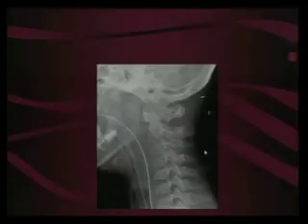Okay. What if I tell you his GCS is 3? I would look at the line from the basion to the dens. Cool. Start doing your measurements there. Okay. Good. And I know you can't measure it sitting there, but you can tell it's wide. Yeah, look at that. Well, I think this was probably about 18 millimeters in this patient. So this was an AOD.